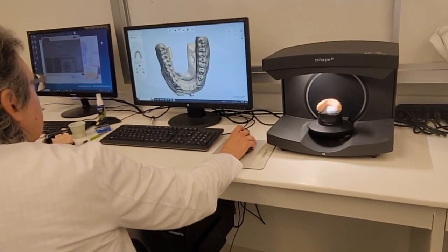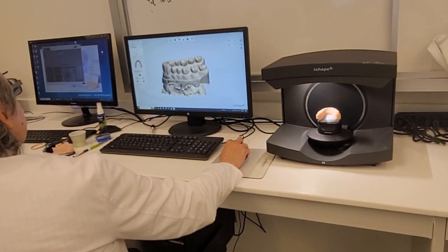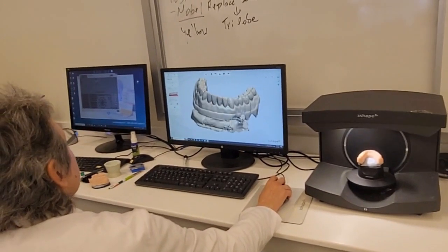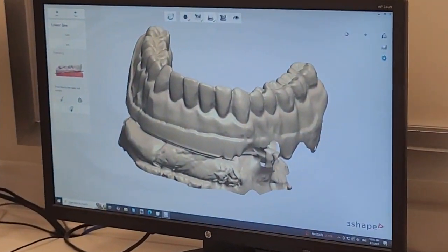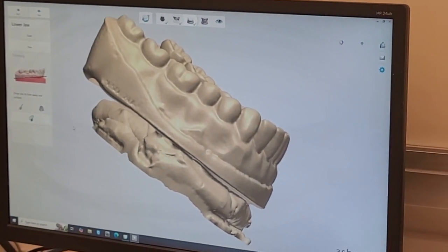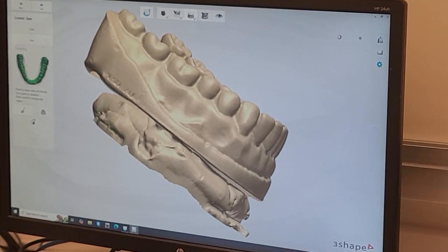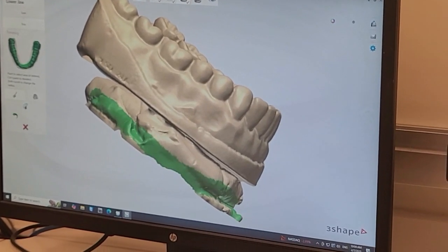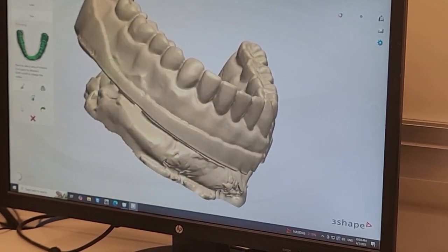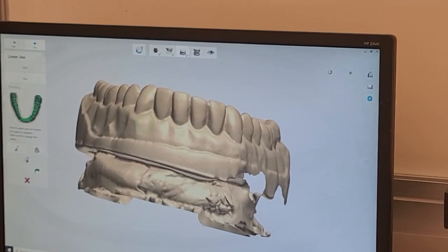So that looks good, right? Oh, I have an option to trim. So let's say I want to trim this model, okay? I can trim, let's say here. Okay, and it cuts off that. But I don't want to trim it. I don't want to spend any time on this. So we can just leave it how it is?